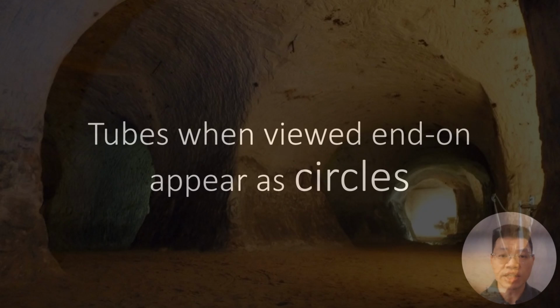The third key concept is that tubes, when viewed end-on, appear as circles. What we want to do is to draw our map as a series of circles by finding the CT view in which the tubes will appear as such. I have enlisted the help of my daughter's teddy bear and a straw to help demonstrate this in 3D to allow you to visualize the concept.